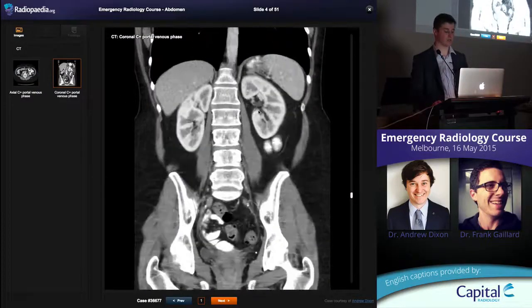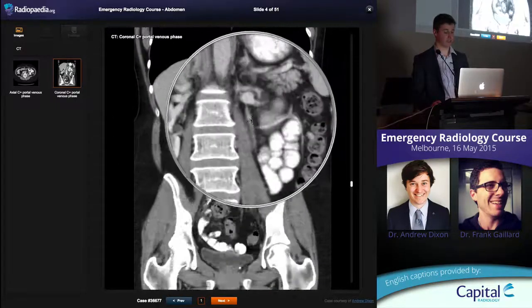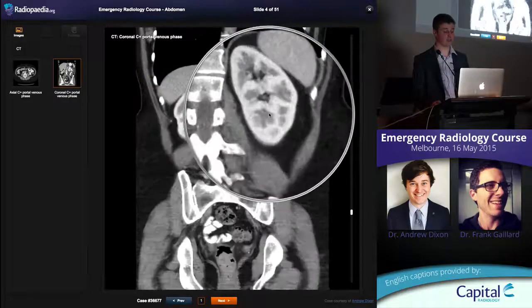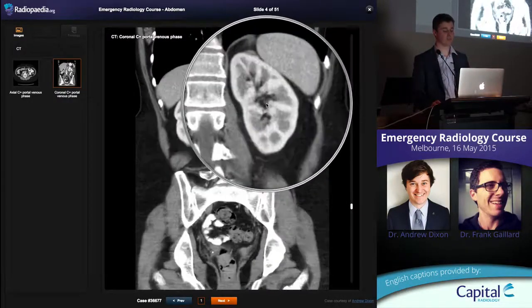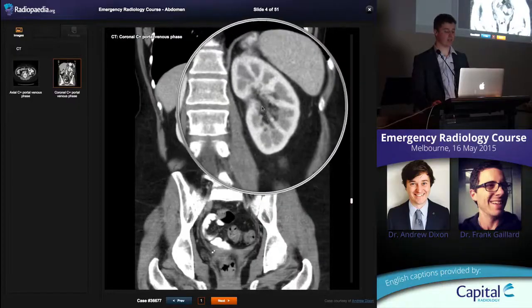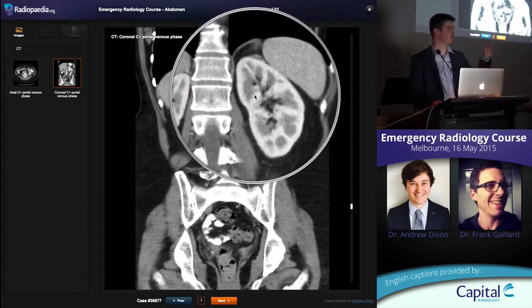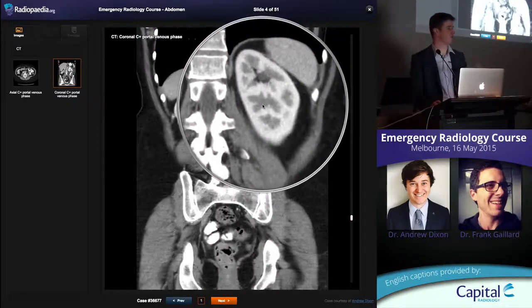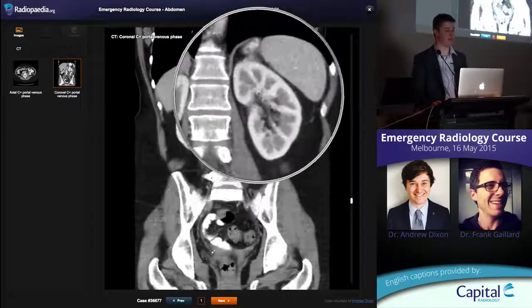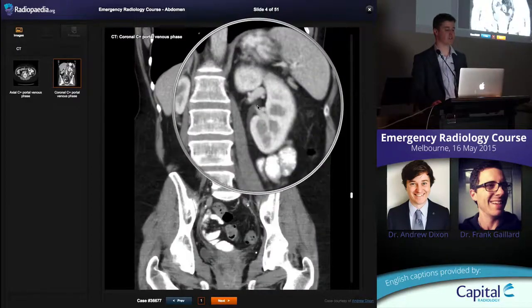The renal hilum contains a renal pelvis, ureter that comes into the renal hilum, and then you have little calyces going out into the kidney. And then you should have this black fat. See that black fat sitting next to it? That's renal sinus fat or hilum fat. That's normal. If you've got hydronephrosis, you completely efface that fat. That fat goes away, and these little calyces start to dilate up, and the renal pelvis becomes massive.